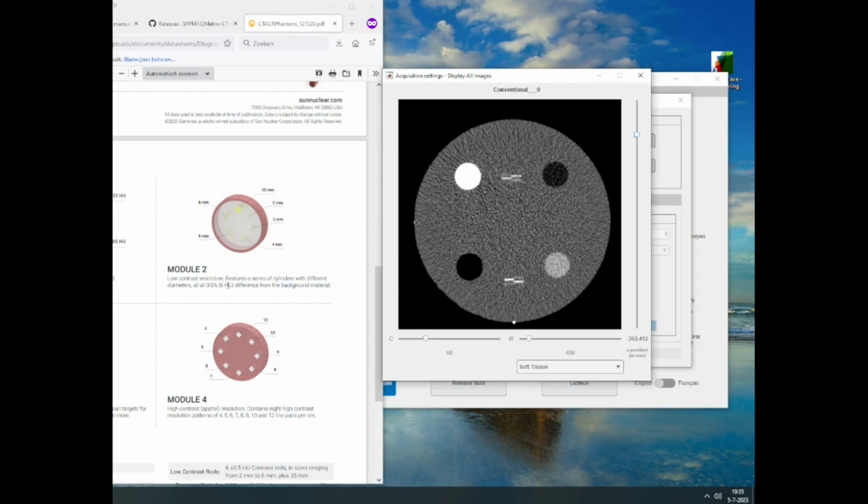You should ask yourself, how does air look like on a CT scan and how does bone look like on a CT scan? What you do know is that bone has a very high Hounsfield unit, means it is going to appear very bright and white on a CT image. So therefore this insert right here is bone. And air has a very low Hounsfield unit and therefore it will appear very dark or black on a CT scan. So therefore this one looks like air and is air.